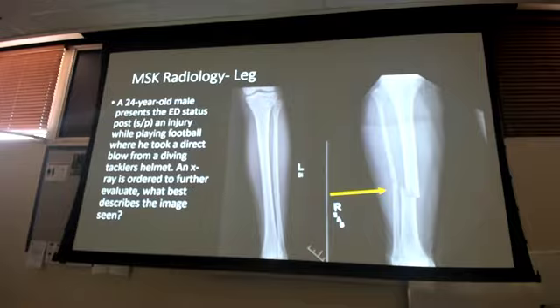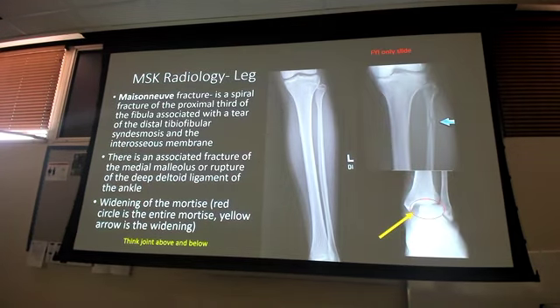It is, but it's still, the fracture line is straight across, right? Horizontal, straight across the main part of the bone. Good.